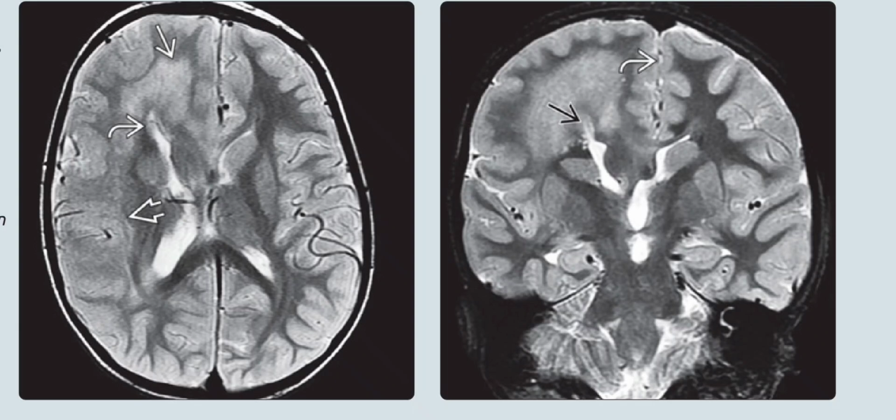On the left is the axial T2 weighted MRI in the same patient, and it shows the enlarged hemisphere with hyperintense white matter, enlarged deformed right ventricle, and thickened dysplastic cortex.